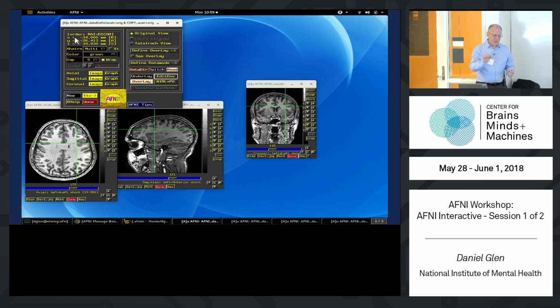And mostly coordinates don't mean too much for anything that's not in a standardized space. So coordinates become important when we're talking about standardized spaces. So we have MNI space, we have Talairach space, we have D99 macaques, we have NIH marmosets, lots of different spaces. They each have a particular template space, and we can report the coordinates for that space in somewhat standard ways.